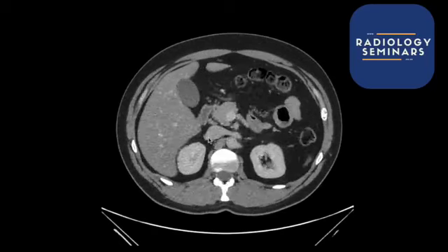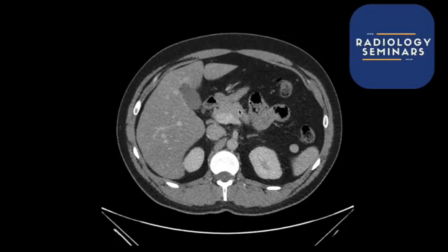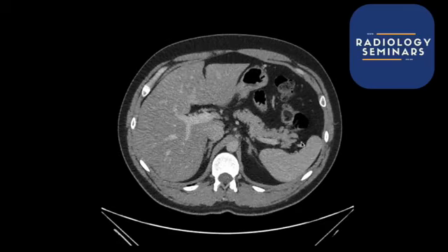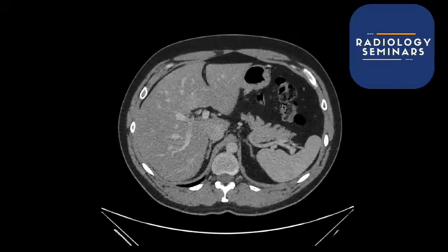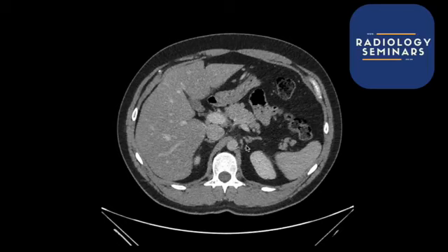So we're carrying on with the biliary tree style of things. We can look at the head of the pancreas, which is going to be over here. And then it's this fluffy, feathery thing that goes along that way, and that way, and that way. Generally speaking, the pancreas should taper. As people get older, it can become quite atrophied. So this is quite a healthy looking pancreas, but you can have fat stranding in that region. You can have all sorts of inflammation, which would basically be pancreatitis.